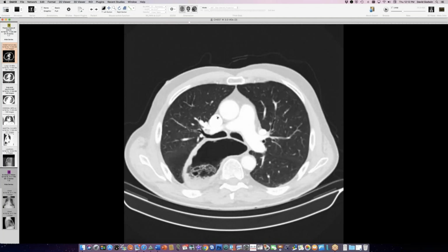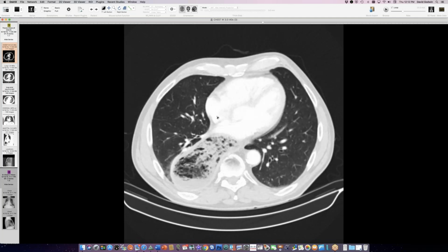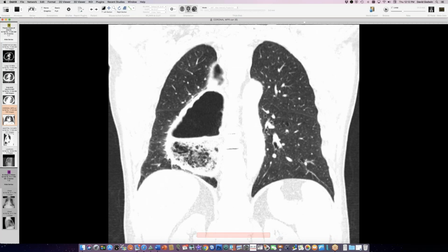And the degree of dilation is also a little out of keeping with obstruction from a cancer. So this was a case of achalasia. Now there are some GI studies that show very disorganized peristalsis and not much propulsion, but I will have to take steps to anonymize those, so I couldn't show those today because I have to cut off some name information that's at the top. So abnormal esophagus here, a case of tremendous dilation by very big achalasia.